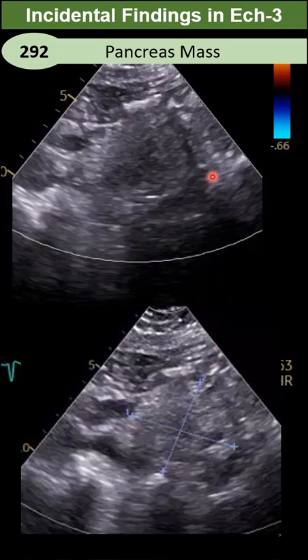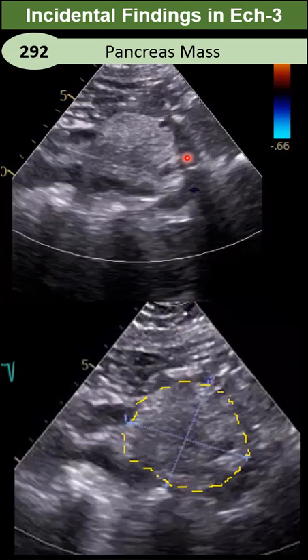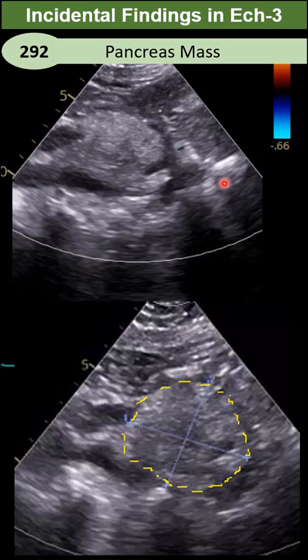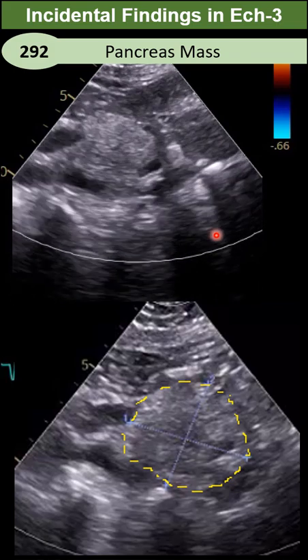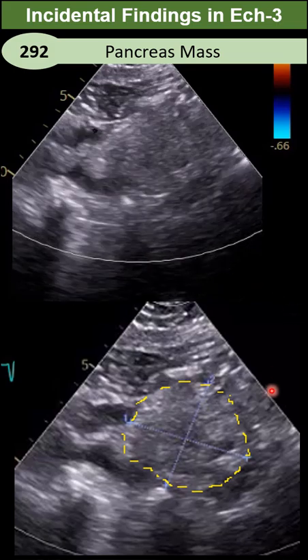So generally, when you have such things, remember that the anatomy and shape are changed because of mass effect. Just find those landmarks, then based on the landmarks, you can decide exactly what structure you are watching.